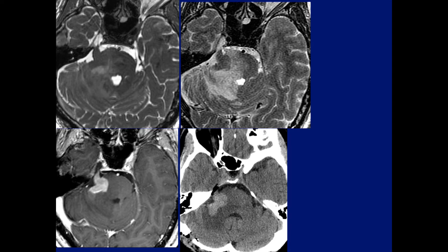What is this condition? Involving a large portion of the pons and the trigeminal nerve. Unlikely to be a schwannoma.